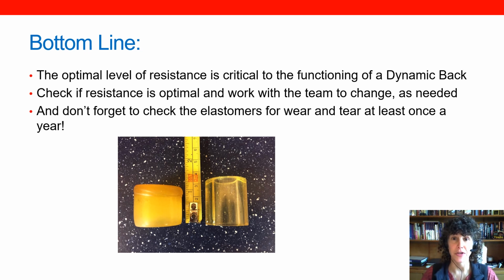The one here on the left definitely needed replacing. You can see there's quite a bit of force that's been occurring throughout its lifetime. Replacing the elastomers allows the dynamic component to continue doing its work in protecting the frame from those forces.